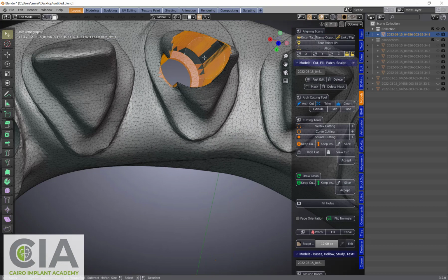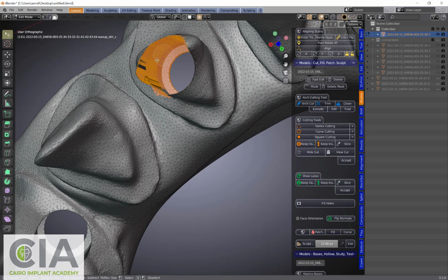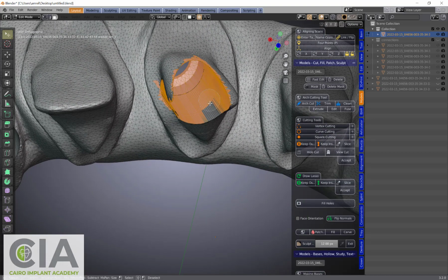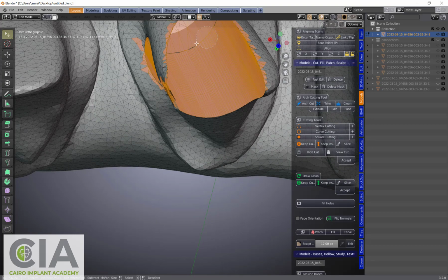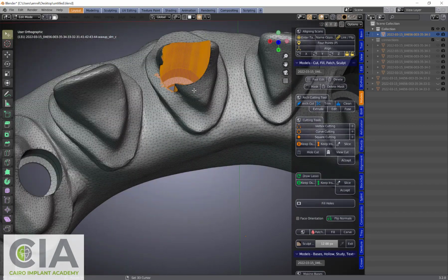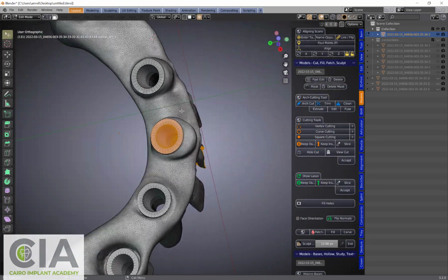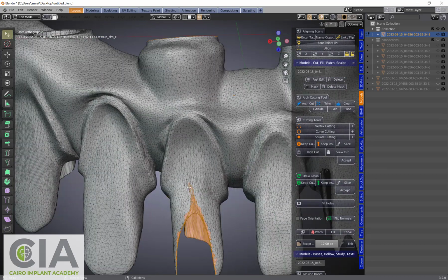Okay, so those are the faces selected for the connection. I'm not very keen on the top part. It's not very important to get this area. This part is very important to record. And this is the consuming part of the job. Probably I will need to do this with all the other 6 connections, but for the demonstration I'm just showing you what we can do.